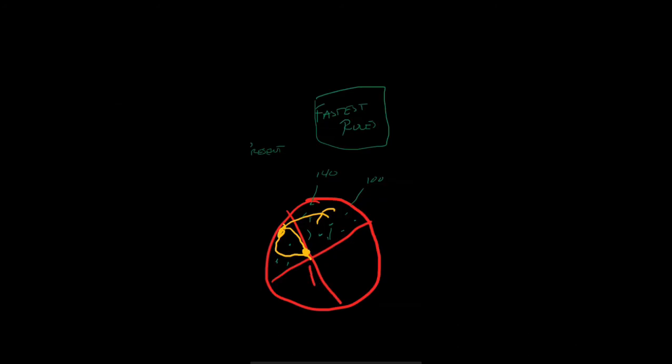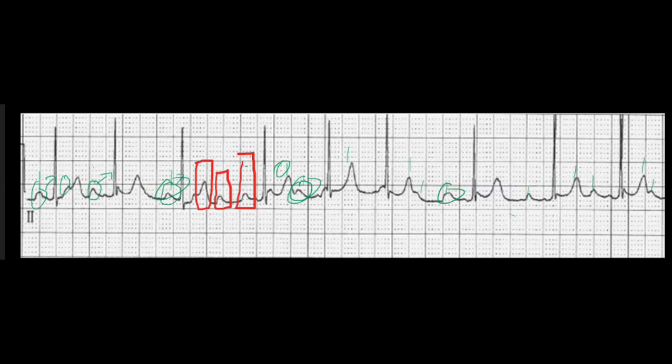So that's typically what is happening: they're moving so fast that the AV junction here is actually trying to control what's going on. That's why you see that they'll come through and they are not conducted. So it may not have been able to be transmitted down, so the AV junction may not have been able to send that down right away, or it held it up. And then when it did send it down, this one actually was allowed to go down and fire off the QRS complex.